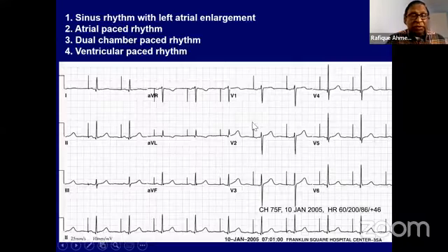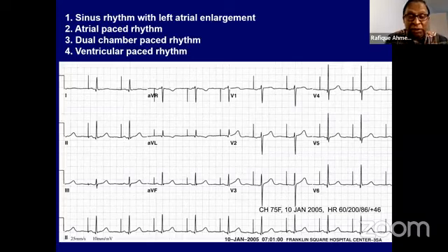So I will show some ECGs and we'll have questions. Do we have the poll? There are 62 participants, except for the faculty, and I would like everybody to answer. Mr. Kamrul, please arrange the poll. Keep the ECG for 20 seconds.